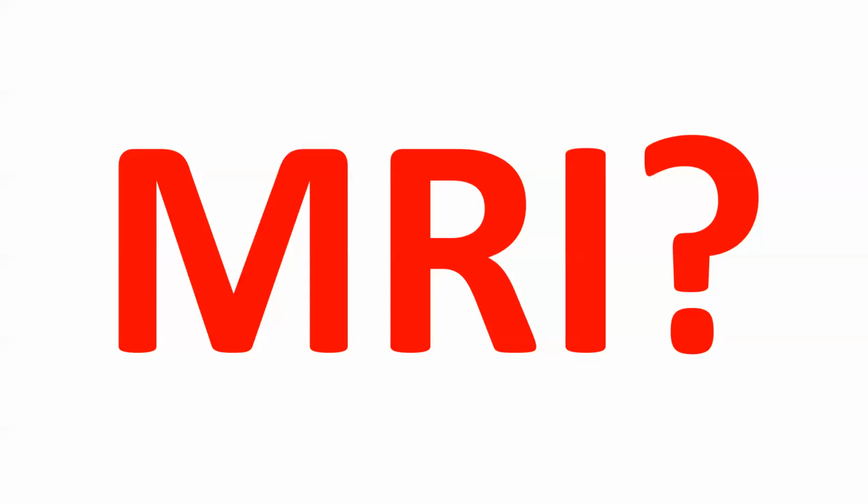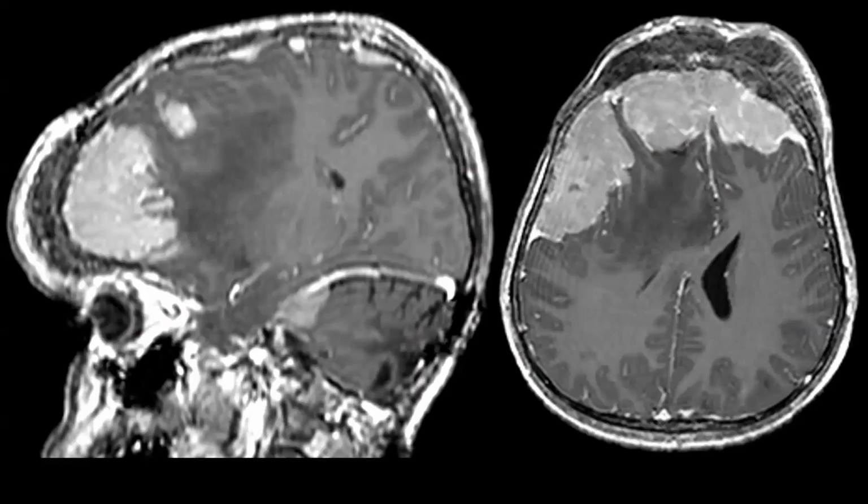Yes, bone remodeling. All right, MRI. There's the MRI. What do you think about that? Okay. What is the sign? What is the sign we're seeing here? It's a classic sign. It's not the starburst. Okay, dural tail. Yeah, dural tail is good. Very, very good. All right, Andrea Gilbert said it first. Mushroom. Sergio Pinovieto. Yes, Sergio. Mushrooming sign. What does the mushroom sign mean?